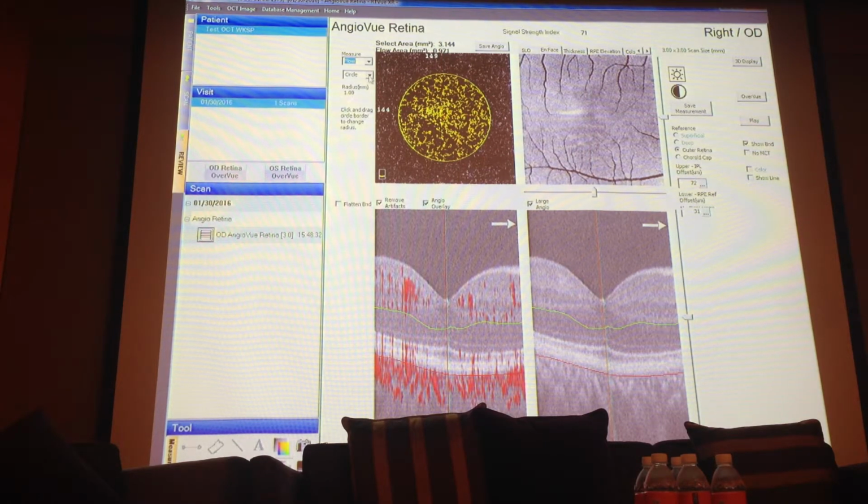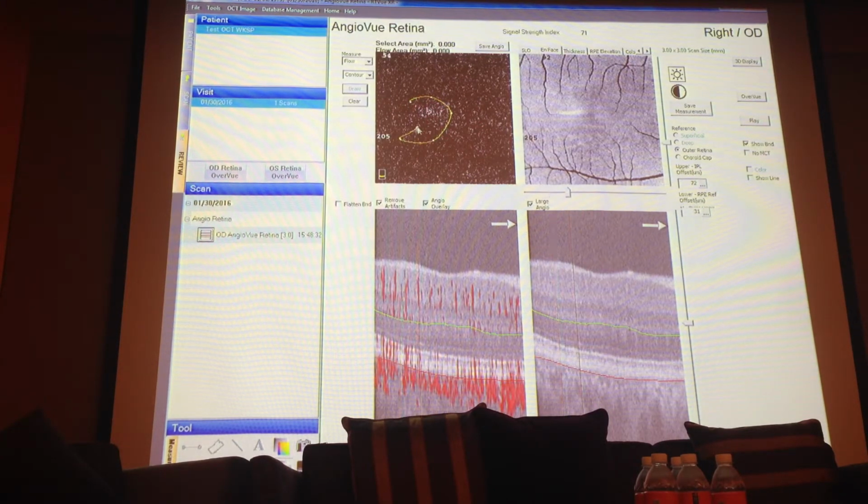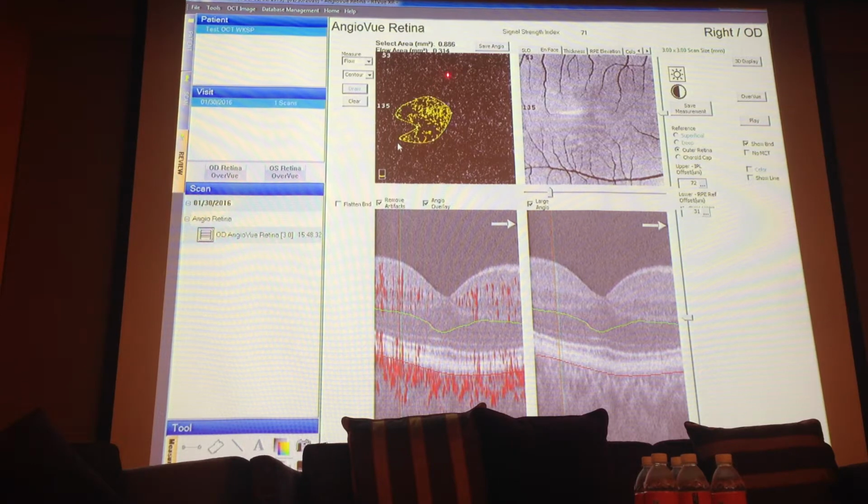Automatically it's a 2 millimeter diameter circle, or we can choose contour. Maybe we can switch to some other. You just draw a boundary manually. Single click, finish by double click. The number will appear over here. And the second measurement tool is non-flow.